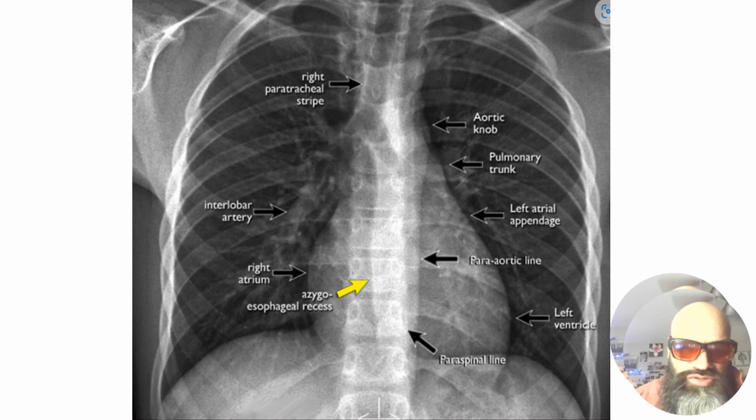I recommend that you go over slides in our PowerPoints that have labels on them, such as this one. This one has layers located such as the aortic knob or aortic arch. You're able to see the trachea here in full form. Here's a carina right here. We can outline that for you, so you can help locate that. Here's some of the hilar vasculature that we see.